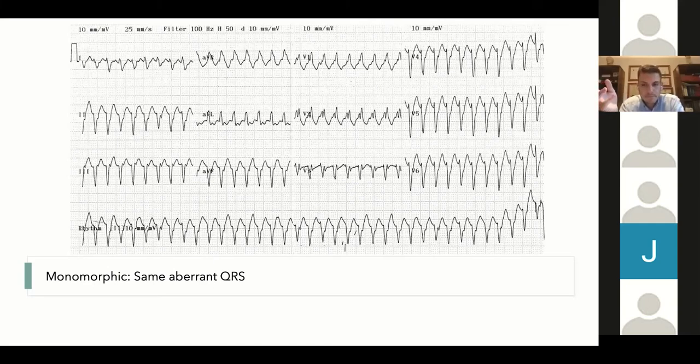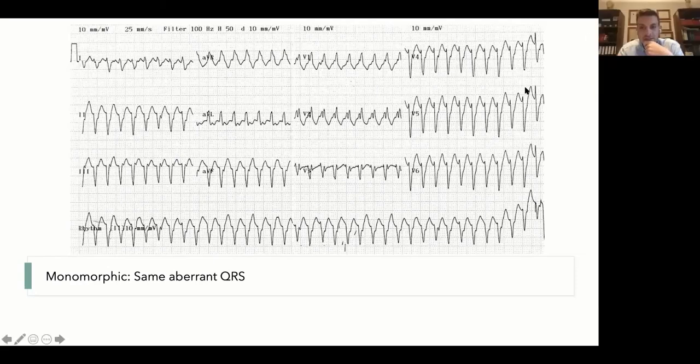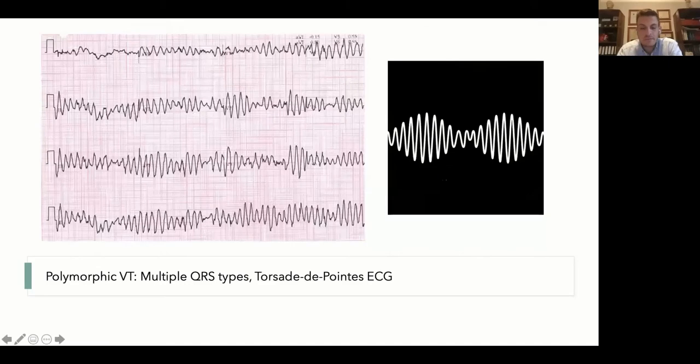You can see the P wave, but there's RSR prime in V1 and V2, so it looks like right bundle branch block. So the origin. No, I want you to tell me that it's ventricular because there's a problem with the QRS, and we will go through it, because you need to understand the origin. There is right bundle branch block morphology. So can you tell me which ventricle it comes from? From the left ventricle? Yes, from the left ventricle. This is actually the toughest theoretical question you can get on an ECG in a state exam of internal medicine.